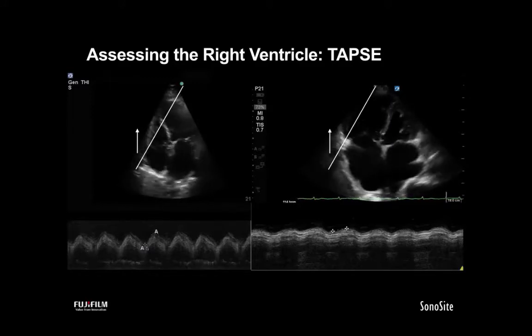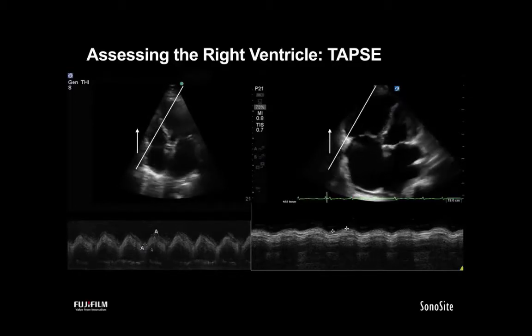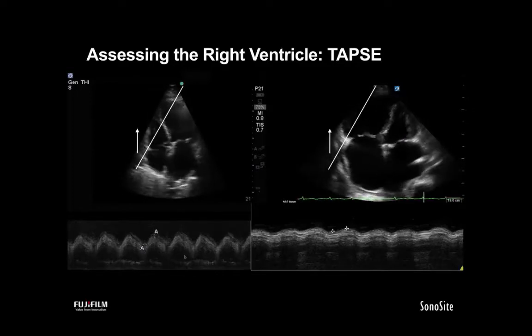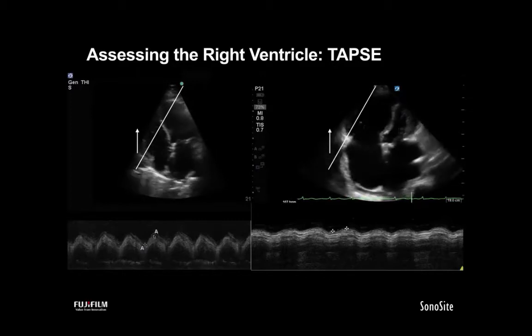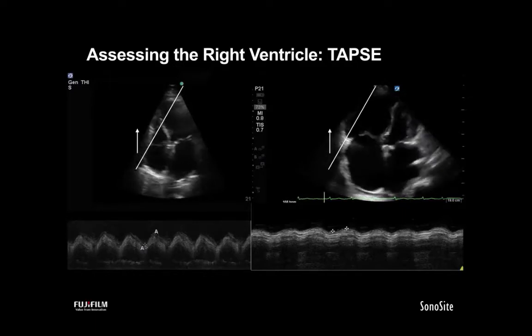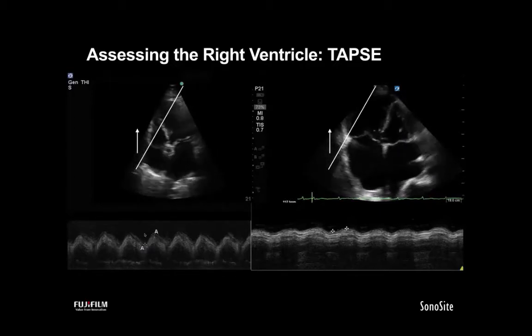It's really just a distance you're going to apply to the relative movement of that tissue plane. So the machine, of course, knows that the x-axis is time. So even when you draw a line that is on an angle, it will automatically take only the absolute vertical distance between these 2 points because it can't integrate time into the equation. So the easiest way to measure it, in my opinion, is just to measure along the slope of the tissue excursion that you see. And the machine, again, will automatically disregard the additional distance covered because you're kind of traveling the hypotenuse of a triangle, and instead it will just take the absolute vertical distance. So that's my pointer there.